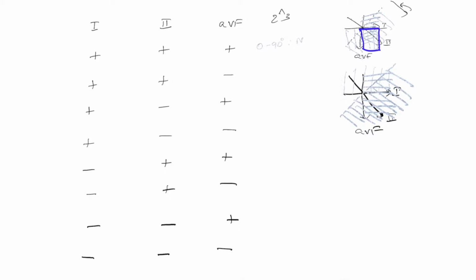So now, notice that the area of overlap is this box right here. So this is where all three lines are overlapping. And because lead 2 is at 60 degrees to lead 1, this must be minus 30, right? So if you think through it, the axis in this case would be 0 to minus 30 degrees. And this is also considered normal. Now, let's go ahead with the third example.